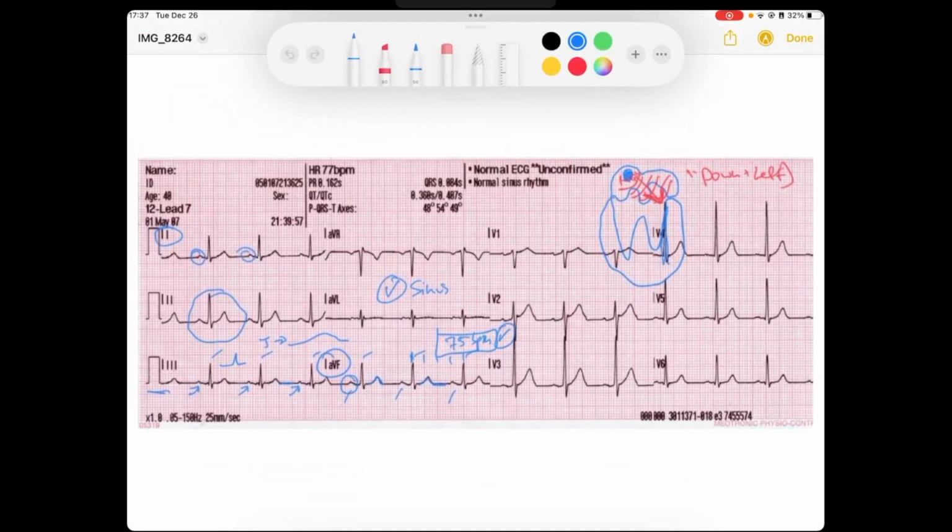The first thing will be our PR interval. So pick anywhere, maybe here we've got beginning of our P, beginning of our QRS. And what I'm looking for is I want to make sure that it's less than 200 milliseconds or 5 boxes, so 5 boxes. And I want to make sure that it's greater than 120 milliseconds because the AV node typically doesn't work faster than that. And if that's the case, we might have some pre-excitation. So we look for that lower end of normal because we know that if it's lower than that, we might have like Wolff-Parkinson-White. That's not the case here.